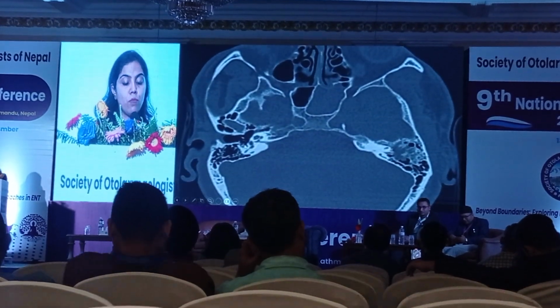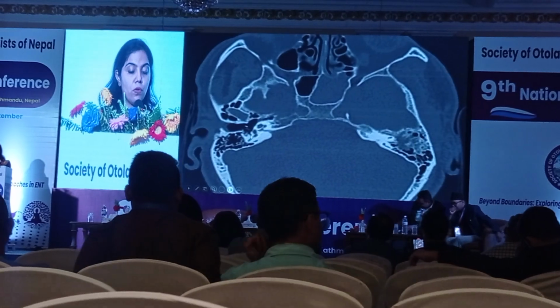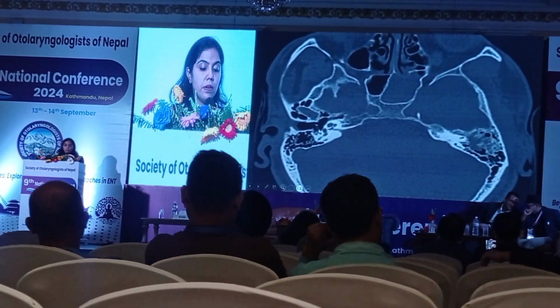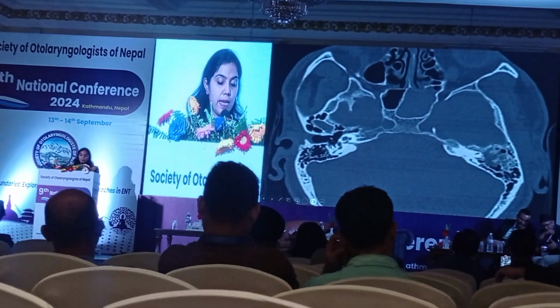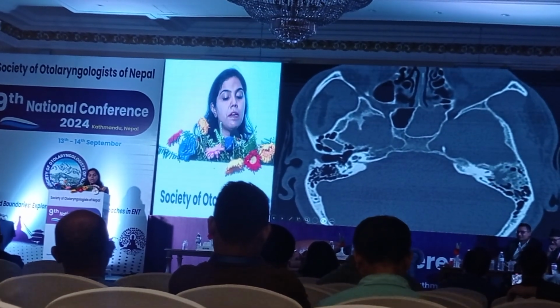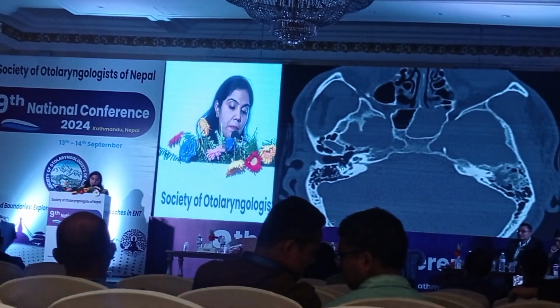And as I move further, I see that this is my cochlea, this is my round window, and this area is a W which is forming here. This is the pyramid which is attending to the stapedius tendon, and this is my sinus tympani, which is an infrapyramidal recess, and this will be my area of facial recess, which is a suprapyramidal recess.